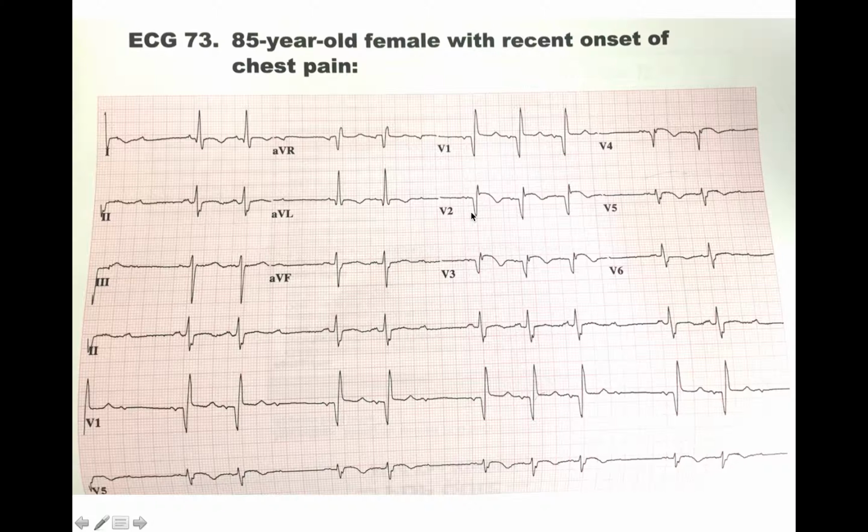Next thing I want to be doing in this EKG is seeing whether or not the PR intervals are elongating, and the reason I am thinking in that direction is because I see these dropped beats in between. The difference between a type 1 Mobitz and a type 2 Mobitz is that type 1 has an elongating P wave or PR interval, where it's short, medium, long, as long as you see it elongating, and then a dropped beat. Whereas in type 2 Mobitz, you don't have a warning where the PR interval elongates. All the PR intervals are roughly about the same length.